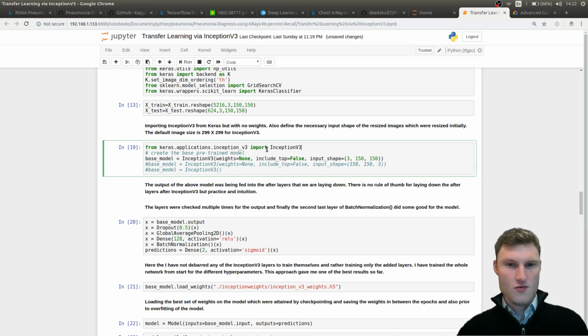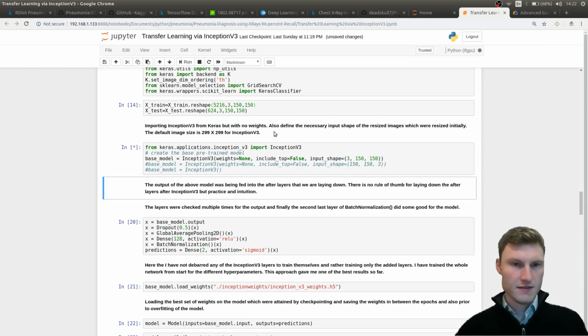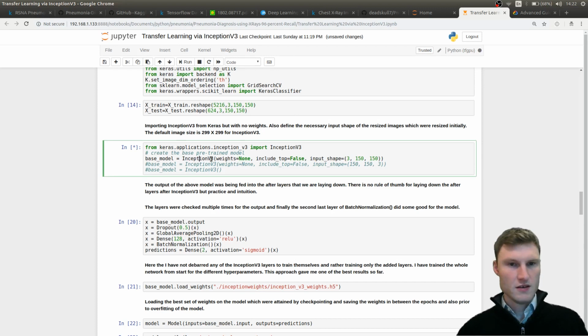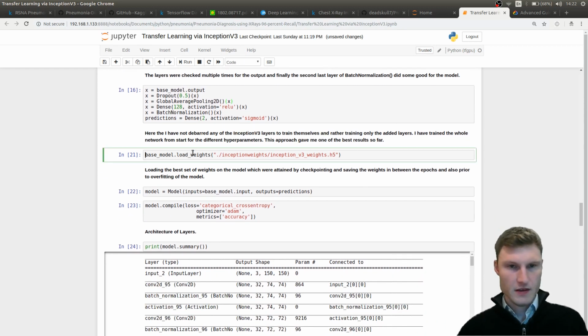Did I run this? I did run this. This is 14. Does it import? It did. And in a minute we should see.